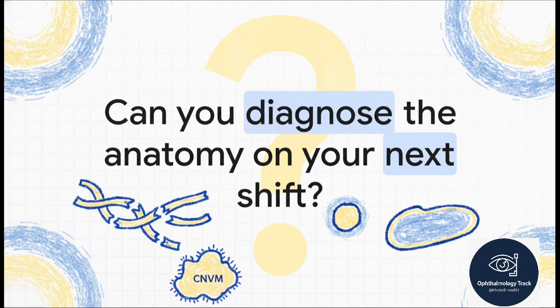Mastering these visual patterns isn't just about acing your exams. It is the ultimate key to quickly diagnosing pathology, guiding treatment, and ultimately preserving your patient's vision.